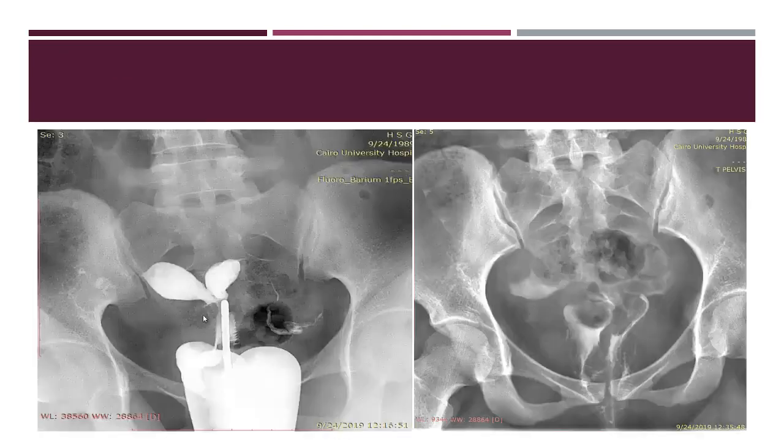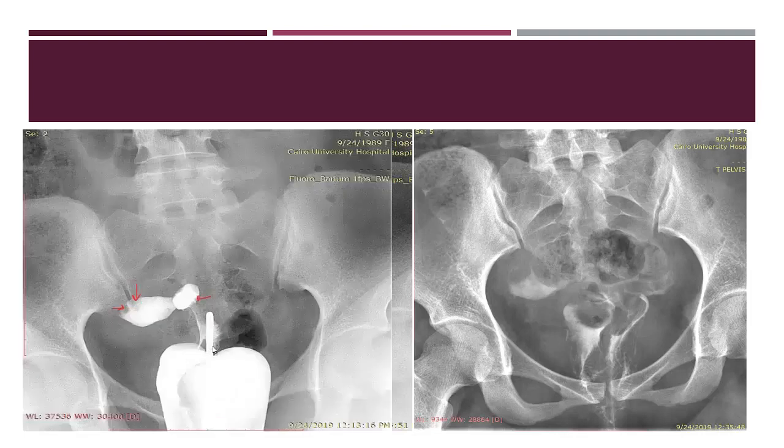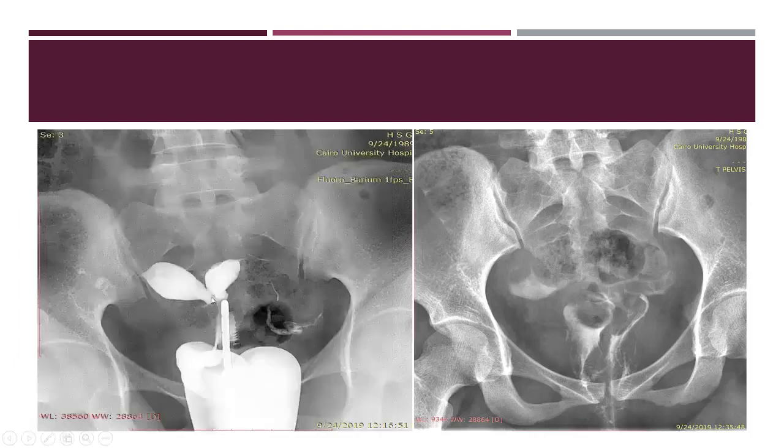This case looks like septate because it is an acute angle. But here, this is a duplicated cavity. In this case, it is a duplicated cavity. This is the plica palmata of the cervix, the normal, and this is the duplicated uterine cavity. But take care, and this is the control film. There is homogeneous smearing of the peritoneal folds. This contrast is in the vagina. It's nothing. This contrast is in the vagina. It is corrugated in appearance. This is the vaginal smearing after the procedure.